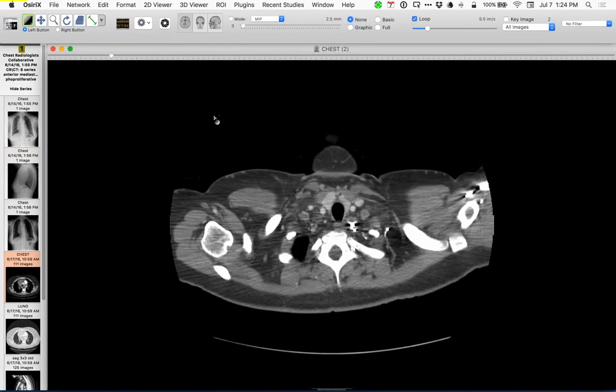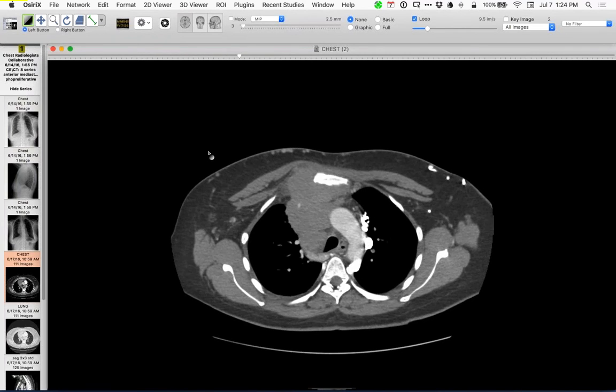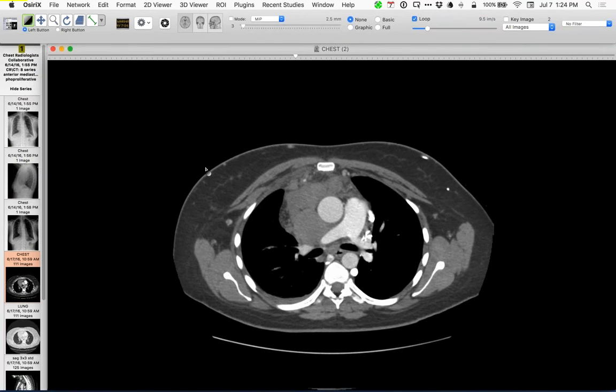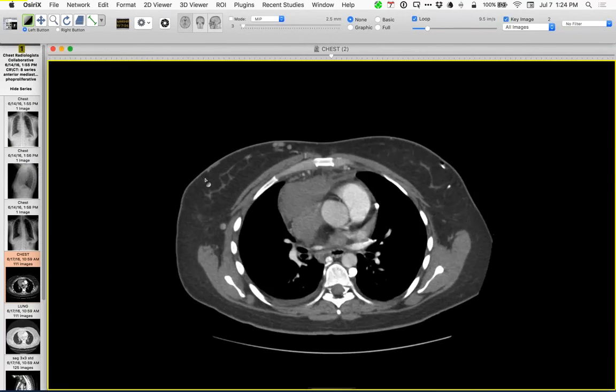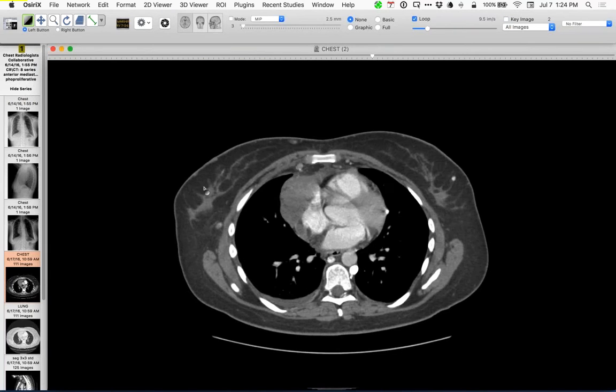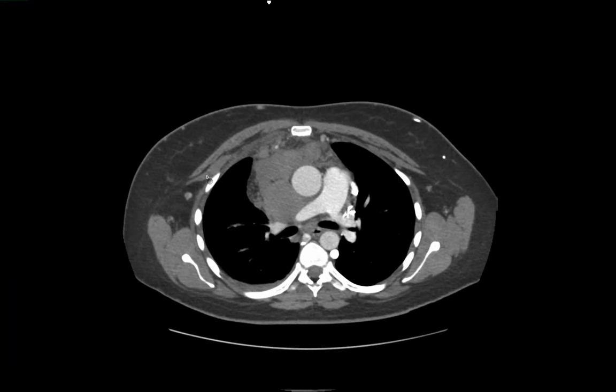And here you'll see the extent of the abnormality. What's notable here is the central venous obstruction associated with it. So there's a lot of abnormality. Looking for the SVC and the usual things, we don't see that, but we see collateral vessels going every which way.